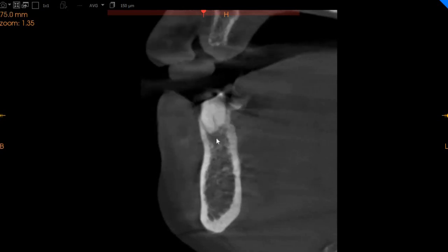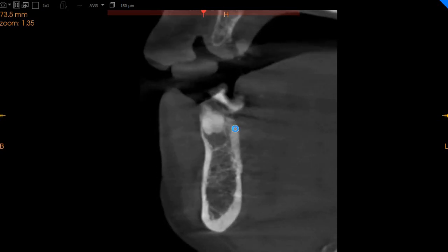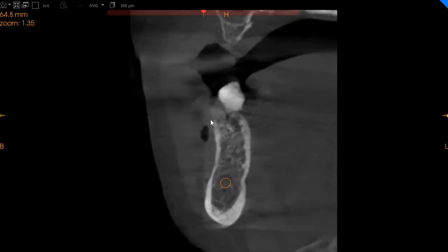In the first premolar region, you've got good bone. This can be extracted and grafted, and then an implant can be placed very comfortably, as you've got 8.4 millimeters of width with 15 millimeters of height. Just distal to this, we've got very good bone again, 7 millimeters of width with 14 millimeters of height. So the lowers can definitely get either 4 or 2 implants placed, and then an implant supported denture.